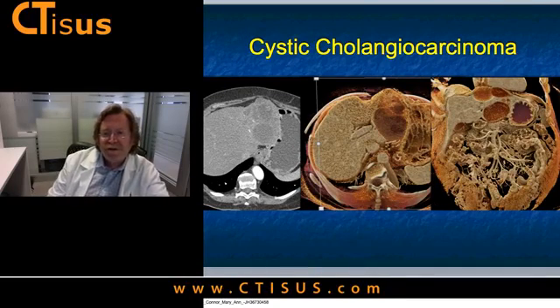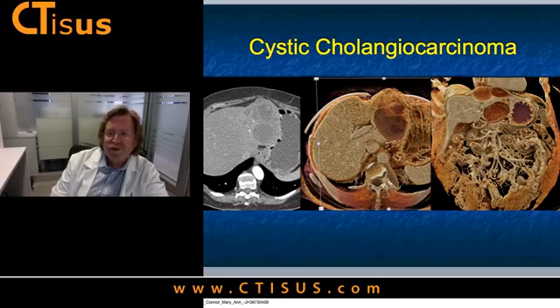We've looked at work on the liver, and I think Linda is preparing a manuscript on liver imaging and submitted something to RSNA. There's a nice example showing you a mass in the left lobe of the liver, which is a cholangiocarcinoma. But you can see when you do the cinematic rendering both the cystic components, the depth of the lesion, extent, and vascular mapping, and you can just imagine this can be helpful in preoperative planning.